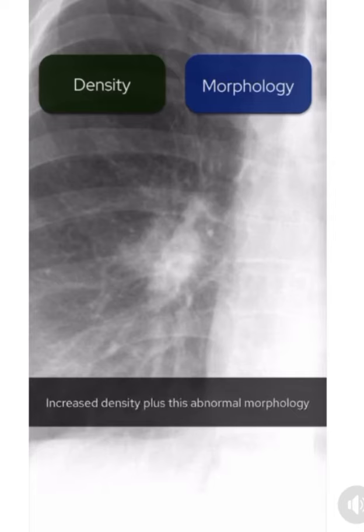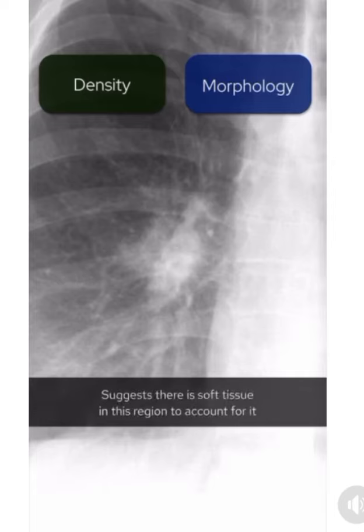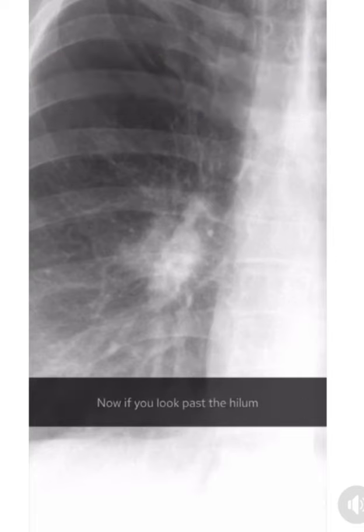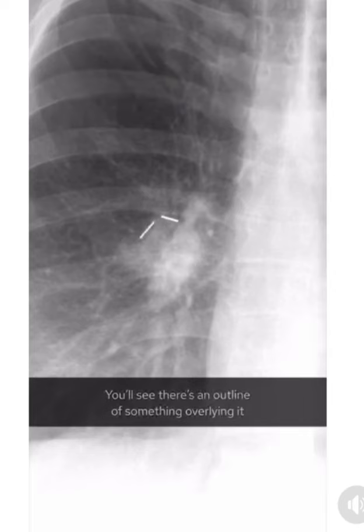Increased density plus this abnormal morphology suggests there is soft tissue in this region to account for it. This means we're either dealing with an underlying lung cancer or enlarged lymph nodes. Now if you look past the hilum, you'll see there's an outline of something overlying it. See how this contour is separate to the hilum, and you can also make out the hilum separate to this.